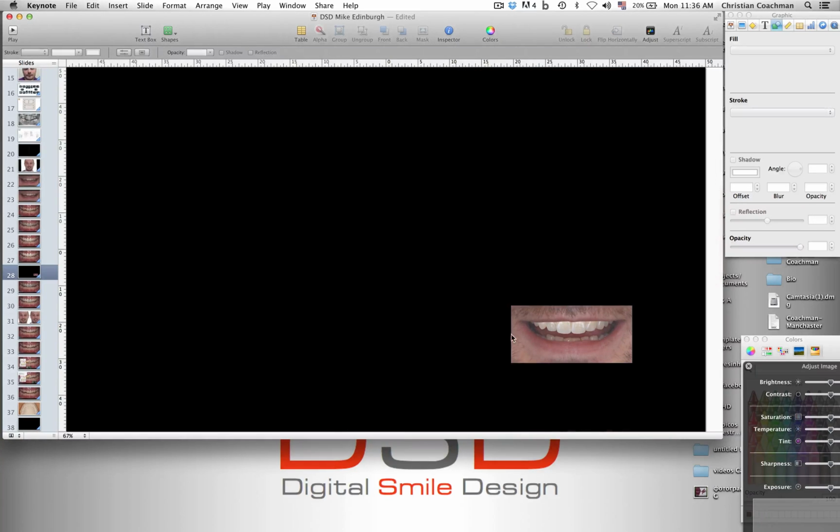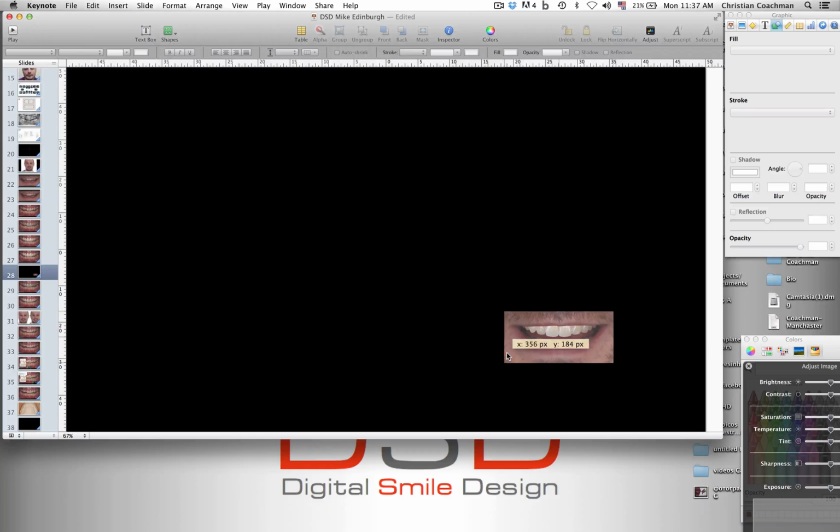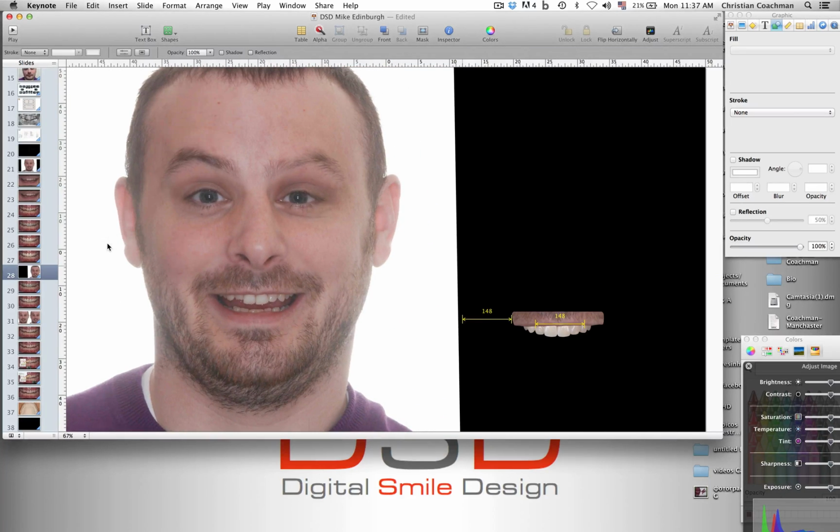Okay, I can make it a little bit smaller. I want to see the whole face until 0 here. 0 is the half of the slide, so I can fit the pre-op. So double click here and unmask. Boom. I have this. Okay.